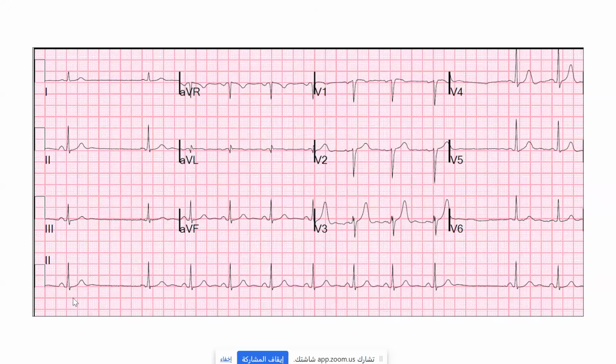So there is a pause, and in the pause there is no P wave and no QRS complex, and then the sinus rhythm resumed. So this pause, what could it be? It is not Mobitz 1 because there is no P wave. Premature atrial, excellent. So it could be premature atrial, but where is this atrial activity? I don't see it. There is no fusion, nothing.